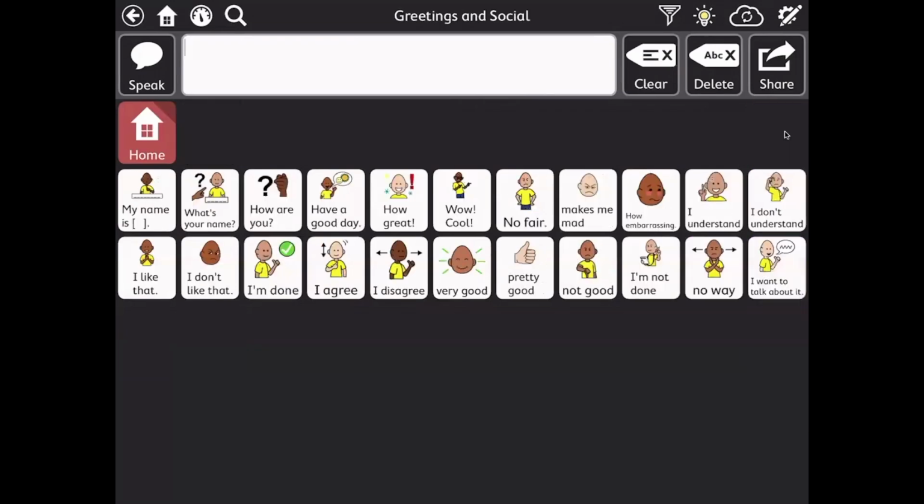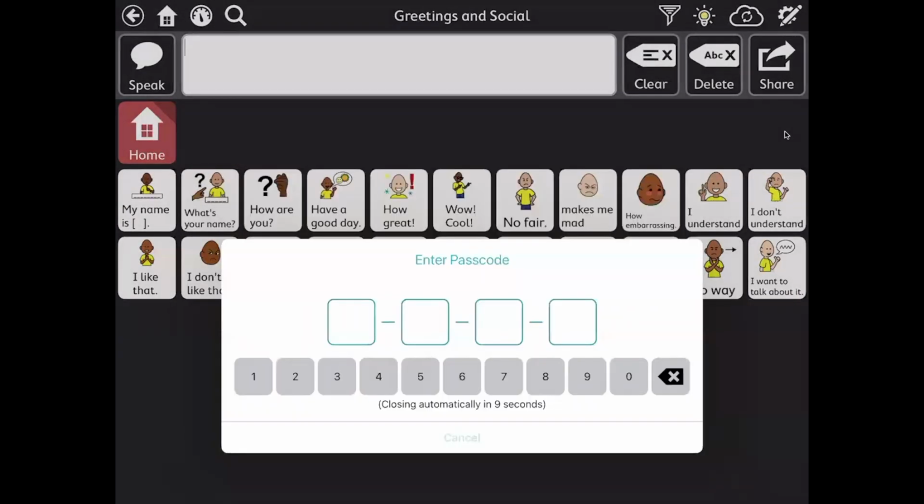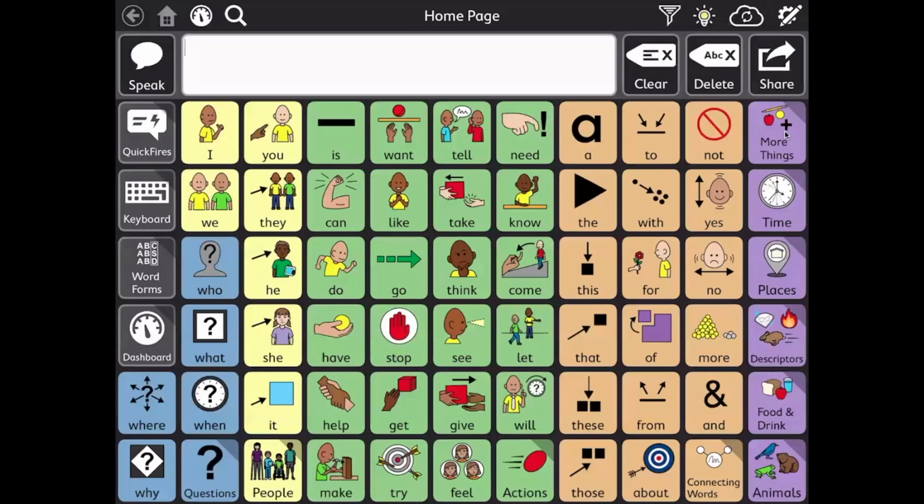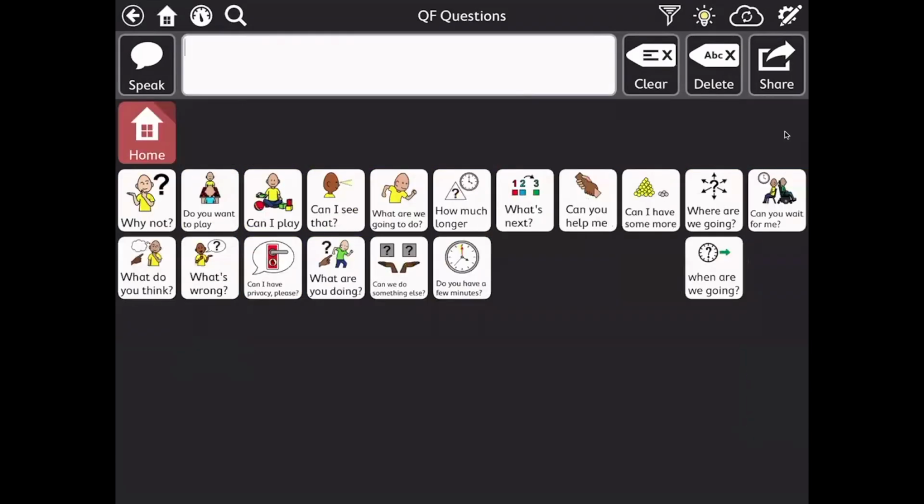So greetings and social have more. Oh, I gotta fix that. Personal needs. I added change diaper. Quick fire questions, specific questions.